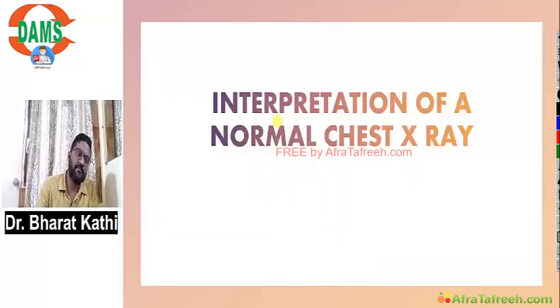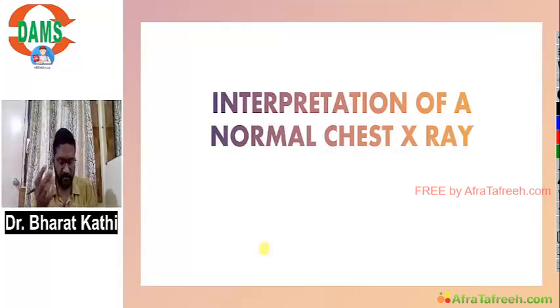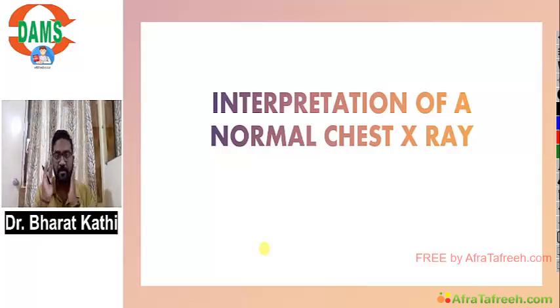Okay. First let us see interpretation of a normal chest X-ray. So most of you, what you do is, if at all in the final exam, the examiner is giving you an X-ray, you'll find out a consolidation and just say it is consolidation, or you'll find out a cavity and just call it a cavity. But the problem here is, the examiner wants you to tell in a systematic manner.